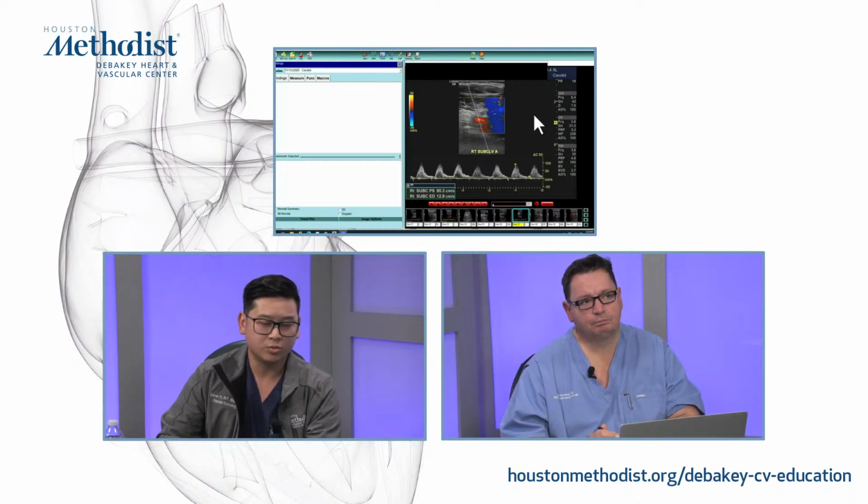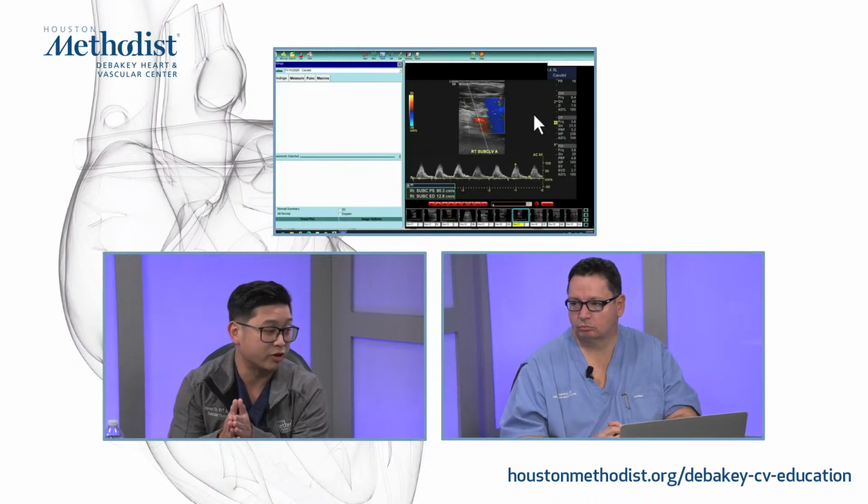There was another point that I wanted to make, the volume flow. Some sonographers might say, oh, well, Dr. Garami, why can't you just go by the peak systole and the end diastole of both and see that there's a huge difference between the two? Why even mention the volume flow? And the truth is that one waveform might be more high resistant than the other, but your end diastole is not going to give you that much information. The volume flow is going to change with resistance. So that's going to be your kicker, like you said, if you had bilateral common or ICA disease, which one would you choose? Whichever one gives you the more blood flow is the one that you're going to avoid, because that's the one that's going to provide you the compensatory flow, right?